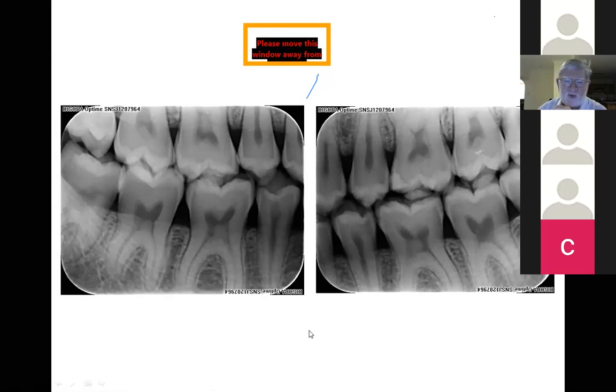Like the guy who's wearing a pair of trousers, and you can see his backside, and the separation between his legs is down to his knees. So here you have a very long crown. The roots are separating very low down. Taurodontism. Lovely, well picked up, guys.